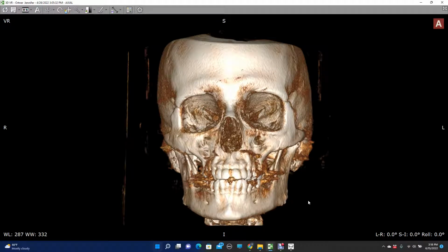Hello, this is Dr. Josh Silver, and today we will be going over how to do an upper cervical orthogonal based analysis of the cranio-cervical junction for any upper cervical type technique using the upper cervical toolkit.